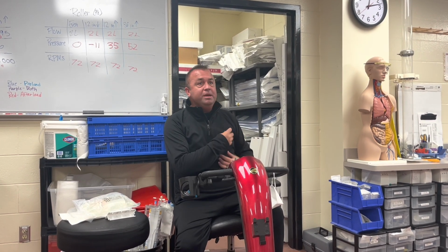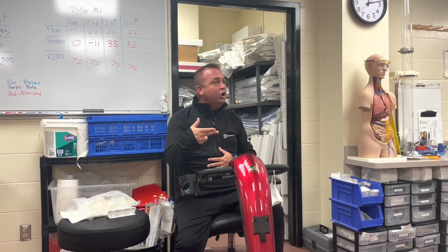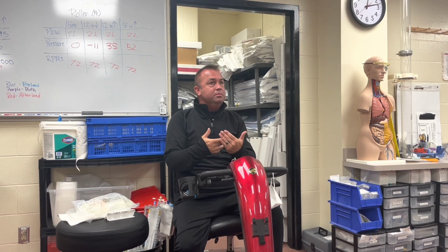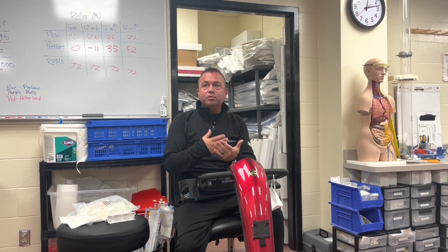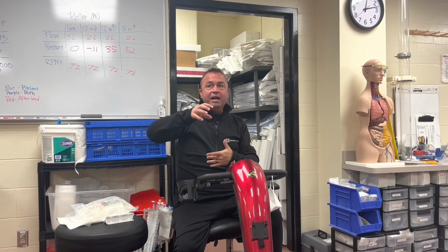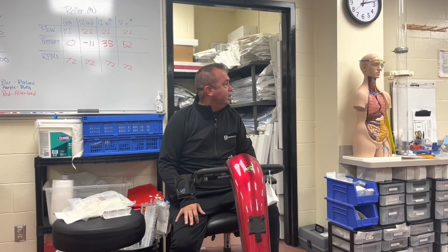Okay, so now we have a big cannula right in the central aorta. It allows us to clamp our perfusion tubing proximally in our system to where the pressure is being monitored. So if we clamp between our pump and where pressure is monitored, now we're reading pressure back on our heart and lung machine right off of the central aorta, right off of our aortic cannula.